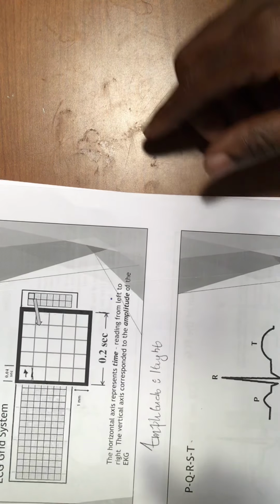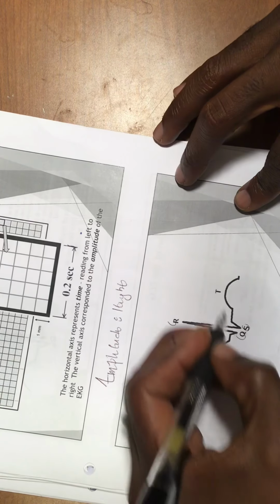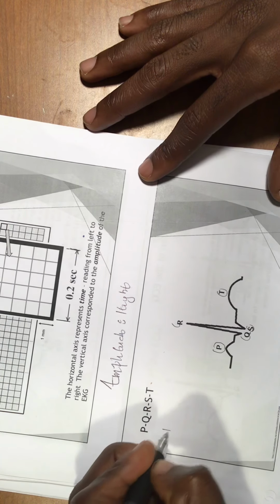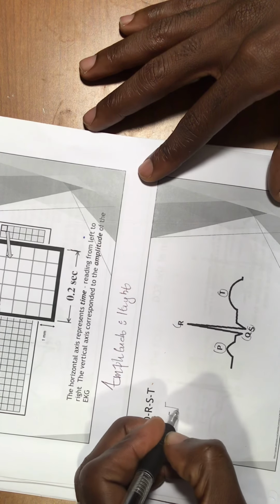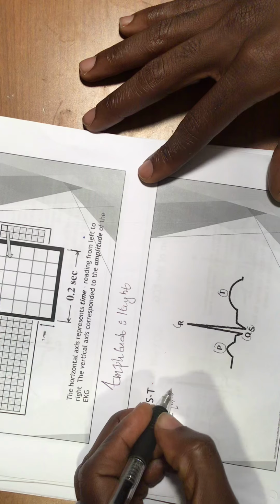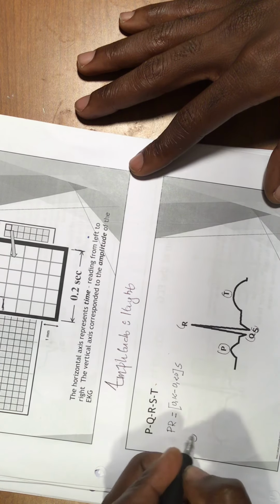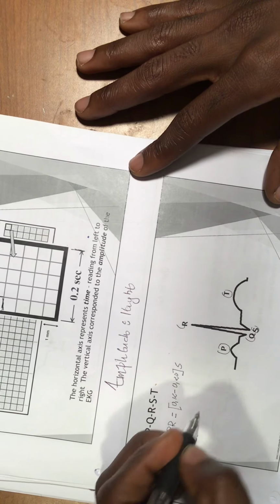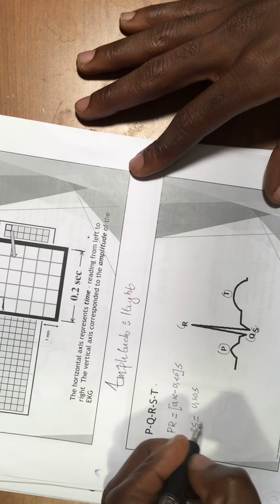This is really important. And remember in the last video that we had, if you can see it well right here, we were talking about the P wave and the QRST. I'm pointing that out to let you know more about it. Remember we were talking about the PR interval. The PR interval is 0.12 to 0.20 seconds. More than that, you have something pathologic. And we were talking about the QRS right here. The QRS is less than 0.12 seconds.